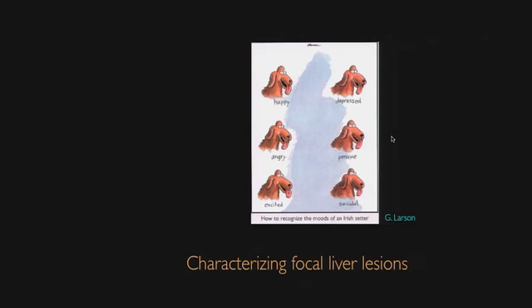So this is exactly the situation that you have in grayscale. In grayscale, you can never really see what it is. Is it really a malignant tumor? Is it a benign tumor? We just had this discussion. And that is, of course, important. That is why we do need contrast. I'll give you examples for that.